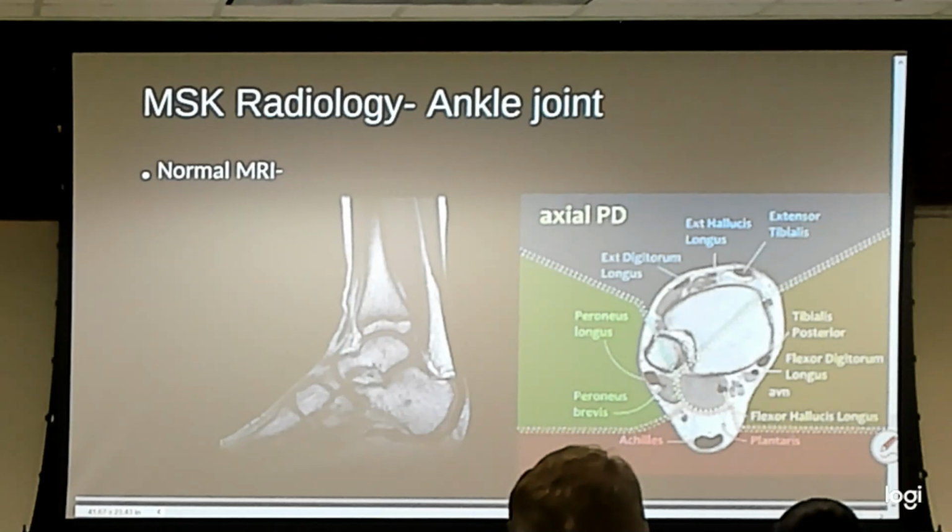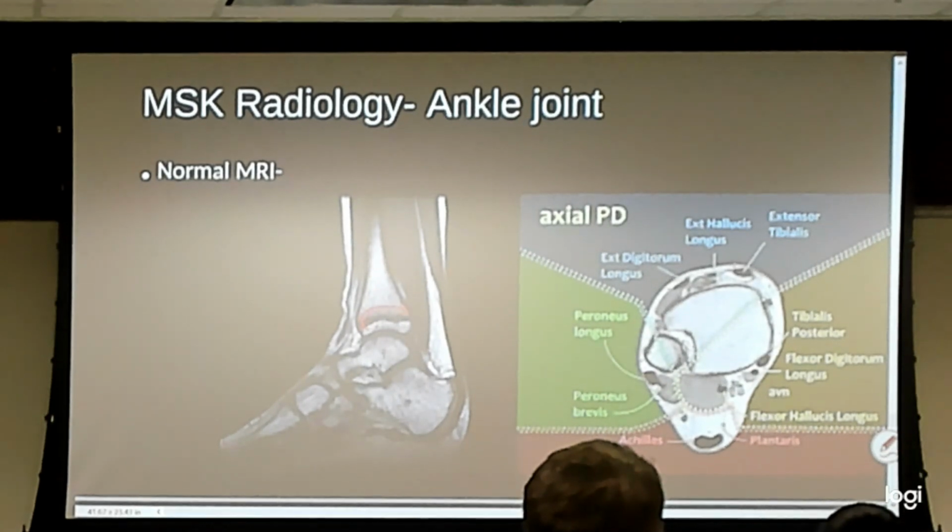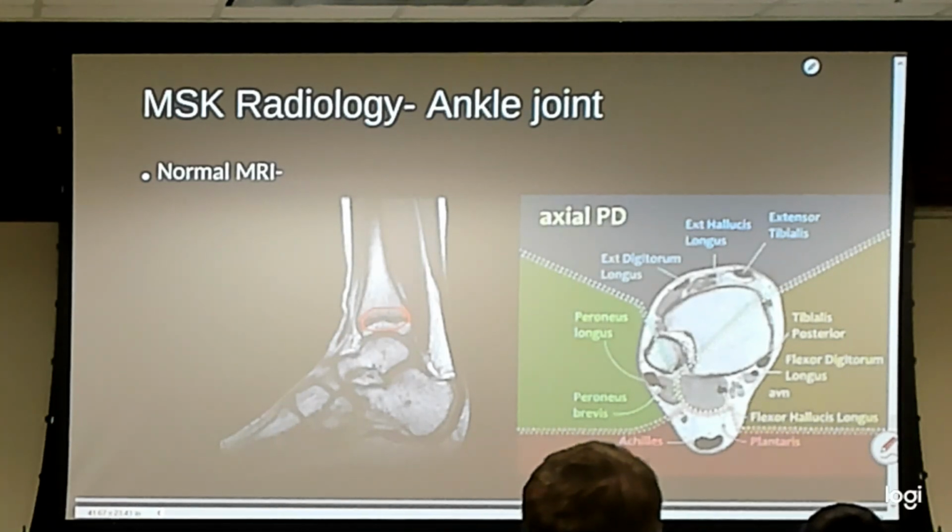Okay, and then we switched to an MRI. I did throw in, I don't remember throwing that in, that was cool. It kind of shows the compartments, what's where. This is a pediatric MRI, just for those of you who care why there's two parts to their tibia.